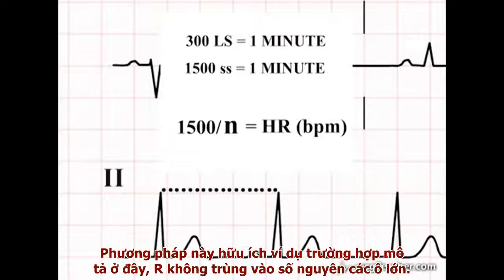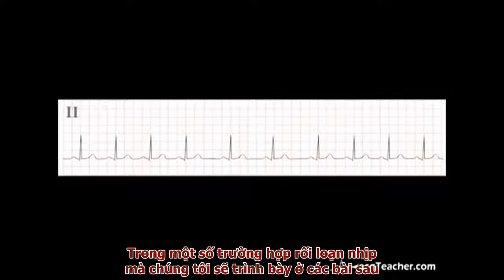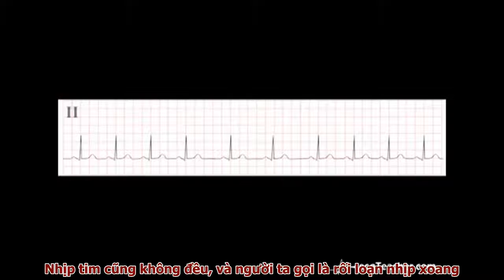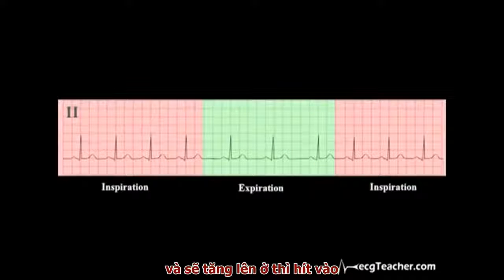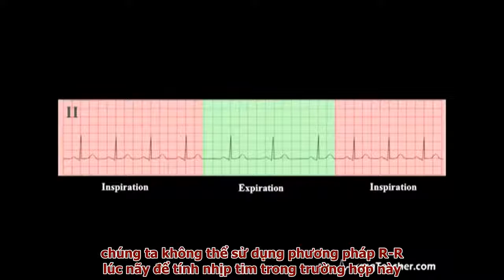This is useful when, as illustrated on this ECG, the R waves do not fall on a set number of large squares. In some cardiac arrhythmias, which we will discuss later, the heartbeat is not regular, and in fact in many normal hearts, as illustrated here, the heart rate is somewhat irregular due to a phenomenon termed sinus arrhythmia. You will remember from physiology that this is a completely normal variant, with the heart rate slowing during expiration and speeding up during inspiration.